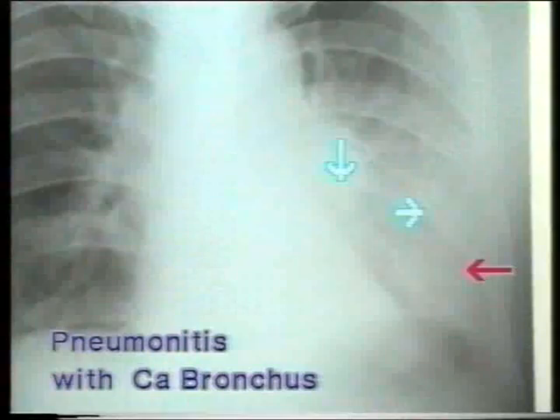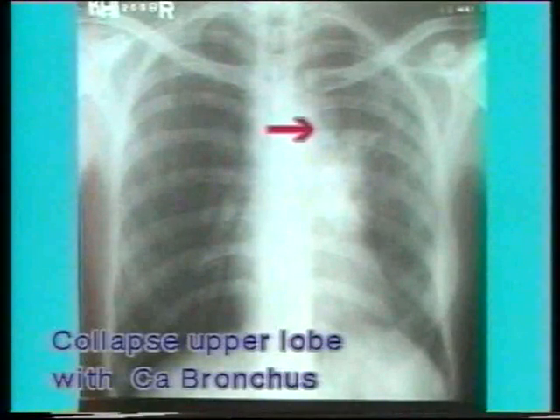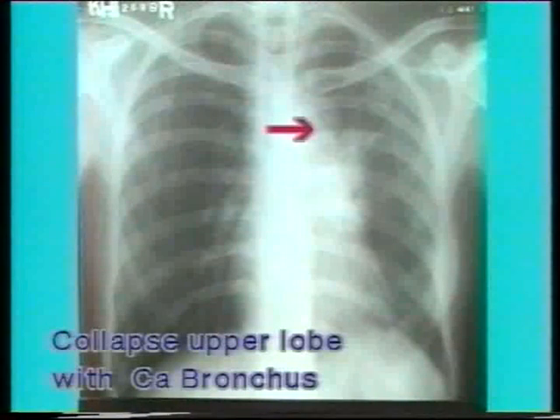The corollary is that when a patch of pneumonia fails to resolve with treatment or resolves partially and recurs, an obstruction in the bronchus must be suspected. If the bronchial obstruction is complete, the affected segment or the lobe collapses. The atelectasis may be sharply defined, or if it is incomplete or mixed with consolidation, then its presence will be indicated by a raised diaphragm and crowding of ribs.